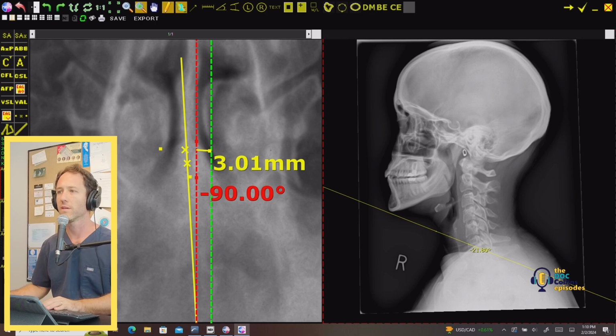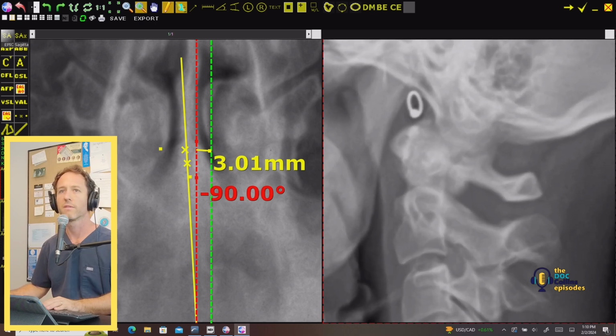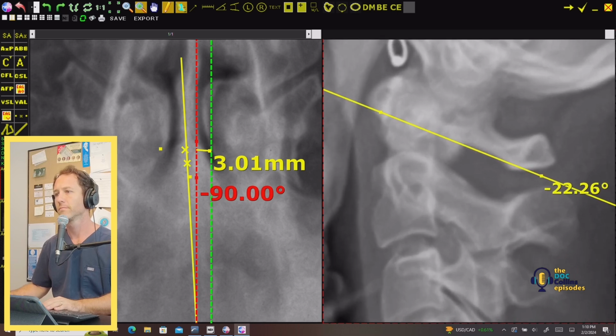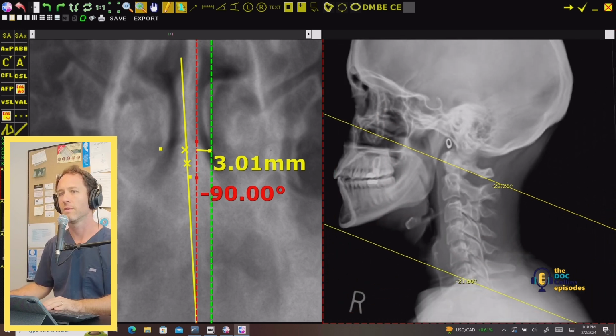It's a cool trick, right? Again, this is taken at 46 inches. So if I have the posterior arch, I know, right? Because I took this frontal film at this angle here.